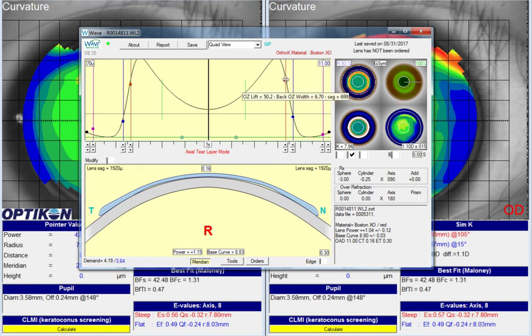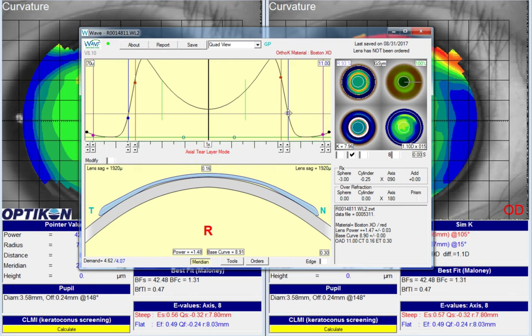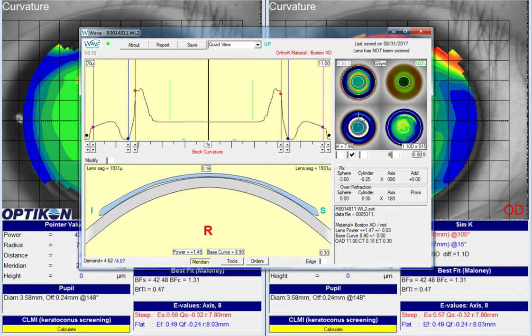When you do that, you have to readjust your placements of the LZ and IC. I think it is at 6.3 here, and 6.9. As long as you don't change the vertical positioning of any of these points, you should still retain the same demand as before. And then what we'll do is go up into the superior quadrant, 25% mode. Actually, let's go over here first.